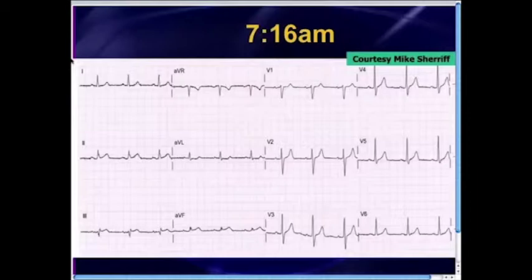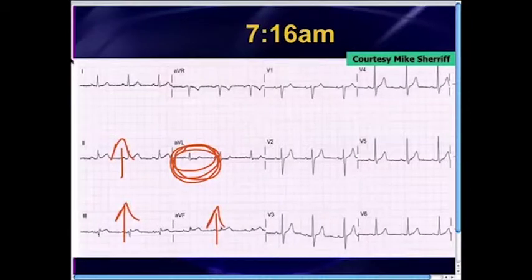Essentially, what these EKG gurus have taught us is that sometimes when a person is having a STEMI, the first EKG abnormality is not the ST elevation. Sometimes the first abnormality in a STEMI is the reciprocal change. Sometimes reciprocal changes occur first, then the STs start to rise. That's exactly what happens oftentimes in inferior wall STEMIs. You get reciprocal changes in lead AVL, and then a short time later, the ST segments in the inferior leads start to rise, 5, 10, 15, 20 minutes later. So that's what Mike was thinking about. Is this an early inferior wall MI? How do you know? You know what?